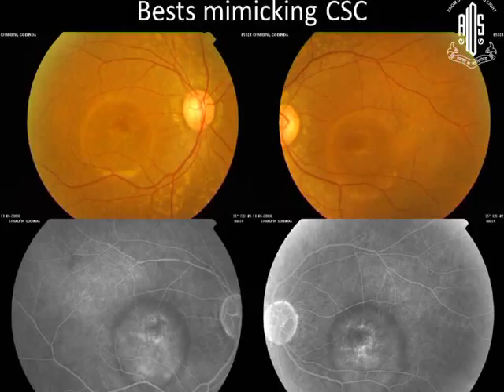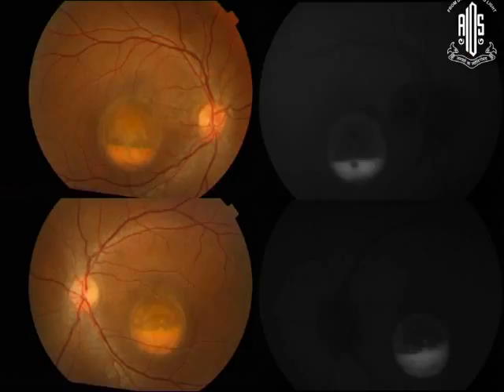This is actually just before the atrophic stage, after the vitelliruptive stage. The yellow stuff would have gone. This is when it's very, very difficult to diagnose what it is. So do an autofluorescence. Beautiful pictures you can get corresponding to the lipofuscin accumulation. So autofluorescence or an OCT will tell us the diagnosis even before we do an EOG.